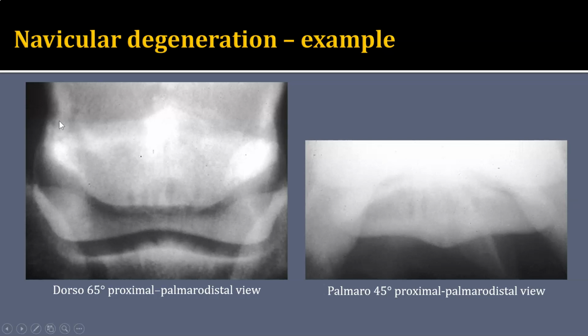In this patient, notice along the proximal margin there is some proliferation, so that is a proximal marginal abnormality. And then this patient has these enlarged and abnormally shaped synovial invaginations. Sometimes they start to look like lollipops or mushrooms, and again, typically they'd be little teepees or cones. So enlarged and abnormally shaped synovial invaginations.